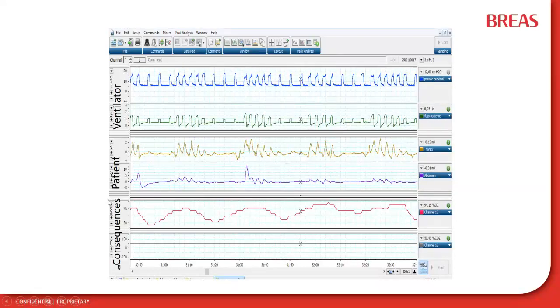In summary, the patient can do two different things against the obstruction: fighting or not fighting against it. For an adequate assessment of the periodic decrease of the flow, we need to measure the inspiratory effort of the patient by inductance plethysmography, belts, or electromyogram.